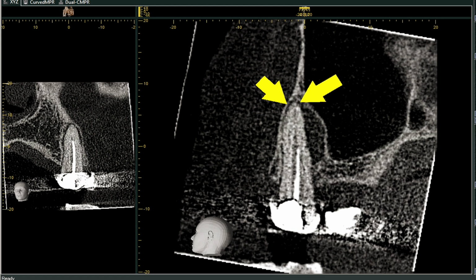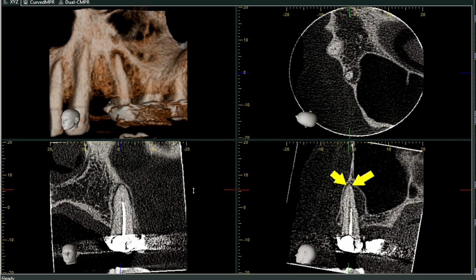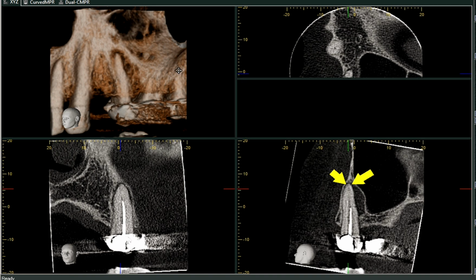The root canal ideally has a single exit. As you can see, the buccal and the palatal canals have fused and form a single exit, but there are chances that there may be some kind of accessory canal and lateral canal. There are high chances that this is the lateral canal and this is the main primary canal. Similarly, you can see the same thing in different cross sections, in the 0.5 mm cross section as well as the 1 mm cross section.